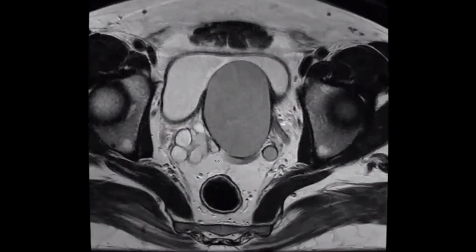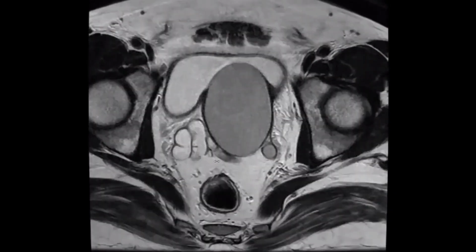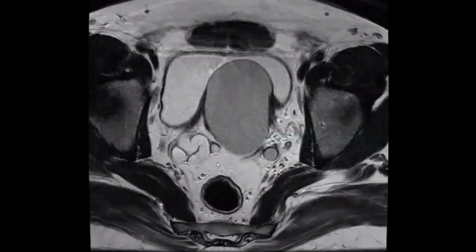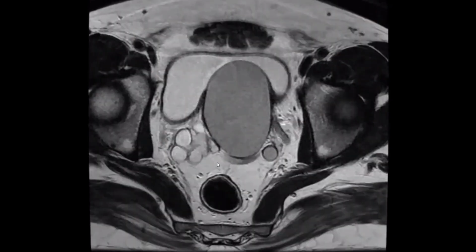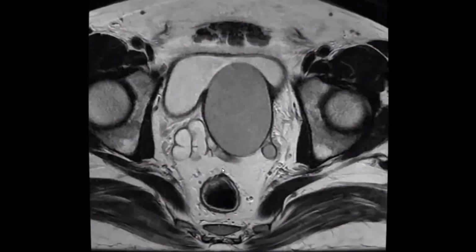As you said, we have left renal agenesis, and here this is the right seminal vesicle, and the left seminal vesicle is not visualized. It is replaced by this large cystic lesion, and as you said, it displays iso to low signal intensity in T2, so maybe proteinaceous content, maybe hemorrhagic content. I would like to add a few other tips here.